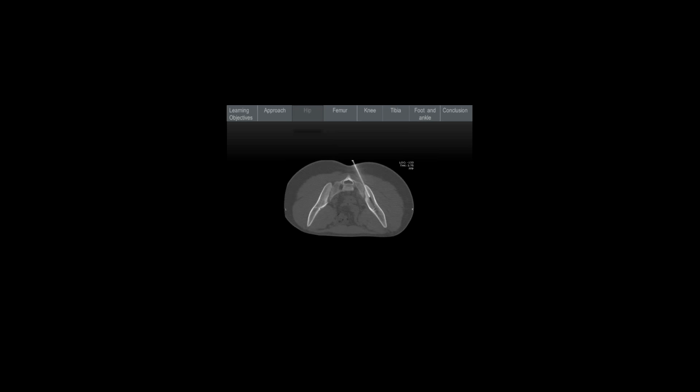If you have any questions, feel free to type them in as we go along, but we'll certainly have some time for questions at the end as well. We're moving from the hip down to the femur. And what we'll do is as we go more distally, we'll look at more and more cases.